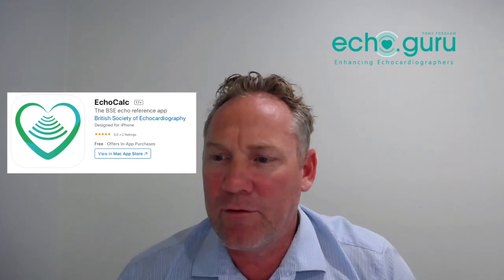So we're going to have a bit of a run through the app today. We'll have a look at some of the settings, some of the cool features about it, and I'll share my two cents as we play with it as we go on through.